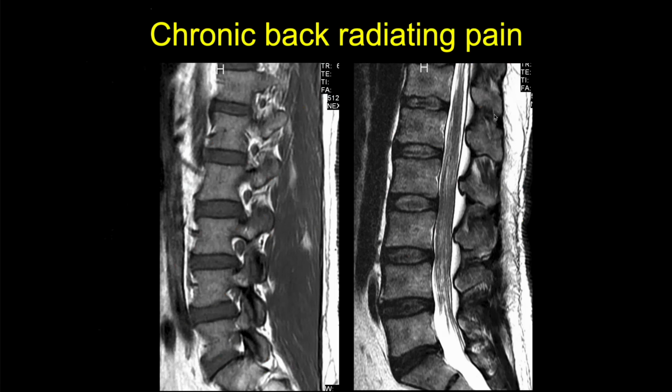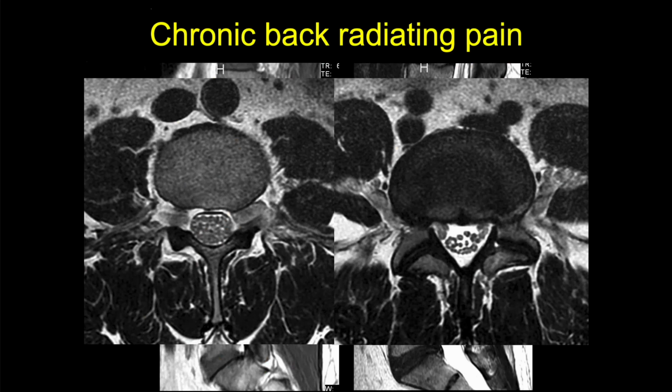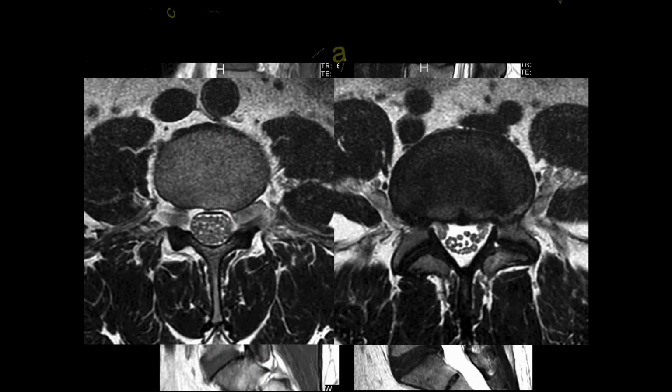Does that look like a normal cauda equina? No, looks thickened. Yeah, the axial images. That's the most horse's hair I've ever seen in a cauda equina. More distal, I think. Looks like they're clumped a bit. Are they clumped a bit, more distal? No, they're not clumped. They're just big. Just thickened. So what might you think this would be?